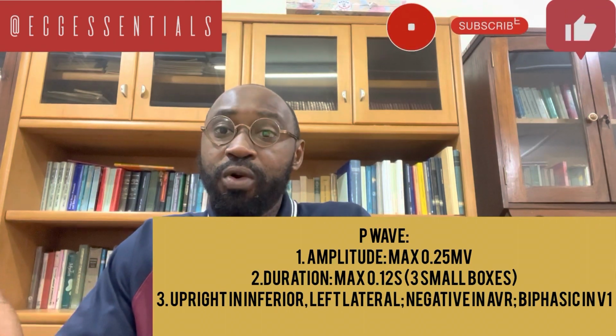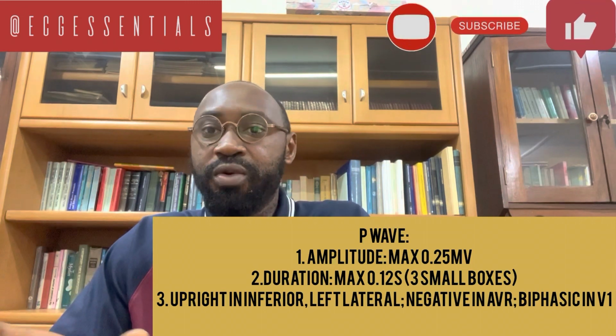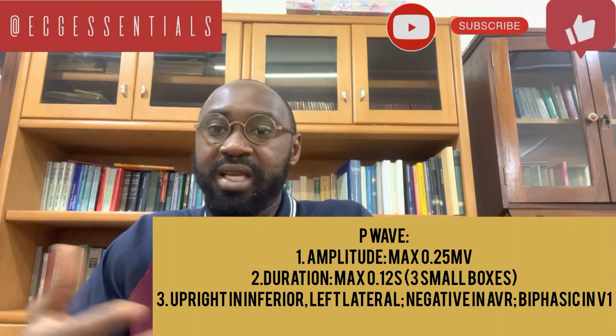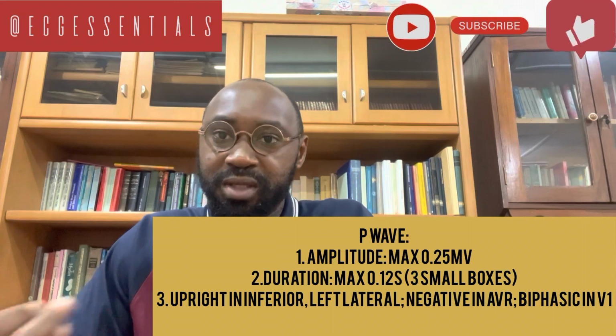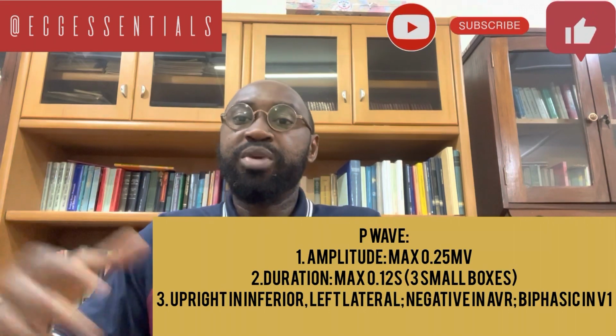Because the overall axis of the P wave usually lies between 0 and 75 degrees, we expect in the inferior leads, particularly in lead 2, which is around 60 degrees in terms of its angle of orientation, and the other left-sided leads, that we have upright P waves.